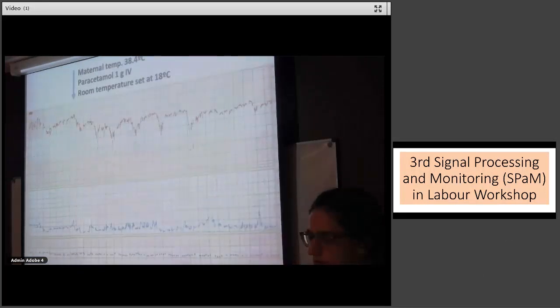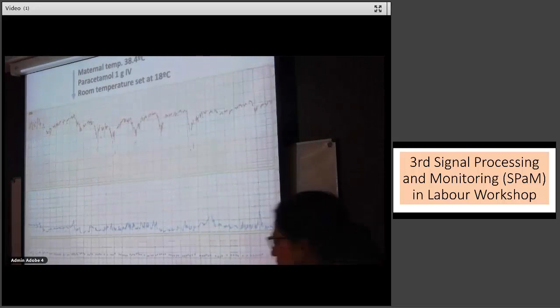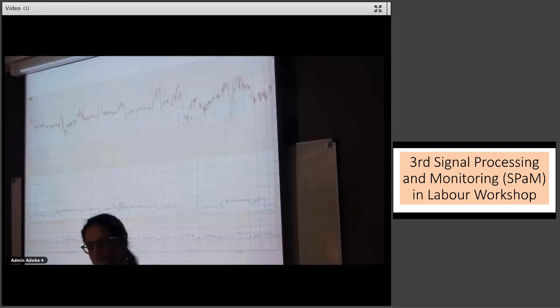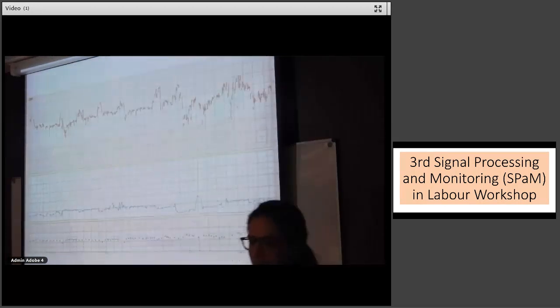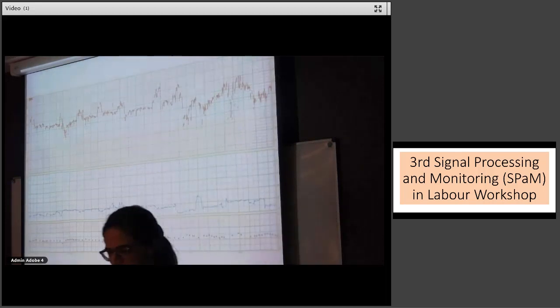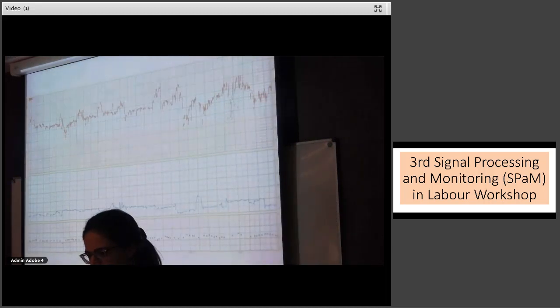I find it surprising that a fetus will switch from this state within a short period of time. Now, if you go forward again, yes, to this state where it's actually demonstrating accelerations. Those 2 settings in the same labor, in the same fetus, within a short period of time, just seem implausible to me. So I think I'm with Barry on this one, that those changes exhibited by the TOCO may actually be correlating with this. And if we knew what the baseline maternal heart rate is, this may well be a maternal heart rate tracing.